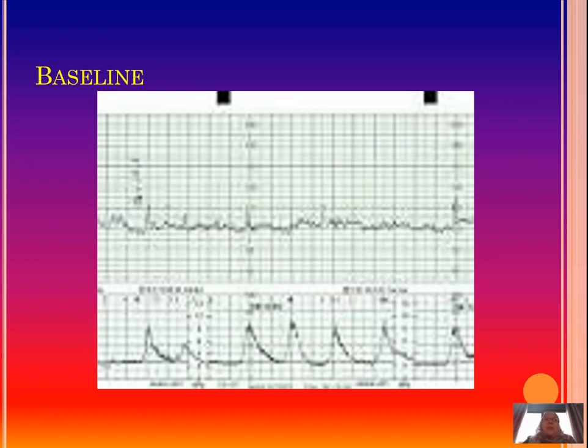But if we just look at the CTG, you can see first the contractions. You see this patient has contractions, and from one row of numbers on the contraction monitoring to the next there are 10 minutes, and you see 4 contractions in 10 minutes. They are sort of regular, although before then she seems to have a phase of irregular contractions. So we might need to have a look at a longer CTG monitoring for this patient.